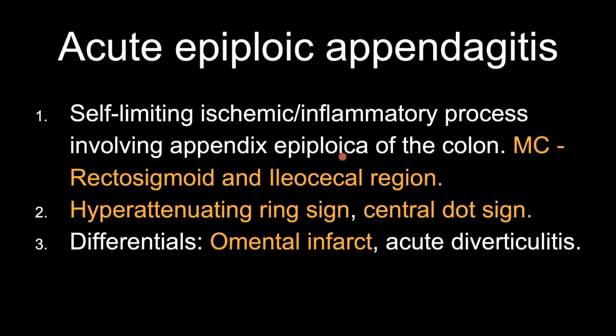The common differential for this is an omental infarct. However, an omental infarct would be larger in size, usually more than 5 centimeters.